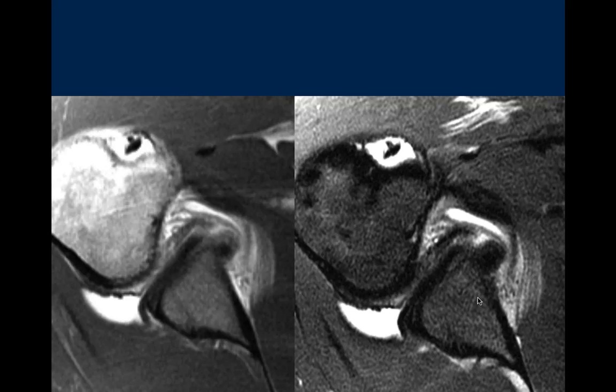So here we have, I presume that's contrast. There's also arthrogram, axial images of the shoulder. I'm not seeing the normal anterior and posterior labrum. They look blunted, and there's some density or attenuation within the joint space that is continuous with the anterior labrum on this side. These are actually streaky portions of the anterior and the inferior. Oh, okay. All right.